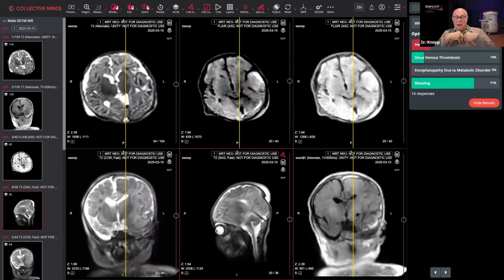And I'll see what Hemant's thoughts are. From my interpretation of hemorrhagic stroke, I'm thinking more about acute ischemic infarct, which has bled into it. So that's the primary etiology, as opposed to intraparenchymal hemorrhage itself. Hemant, do you have any thoughts about that?